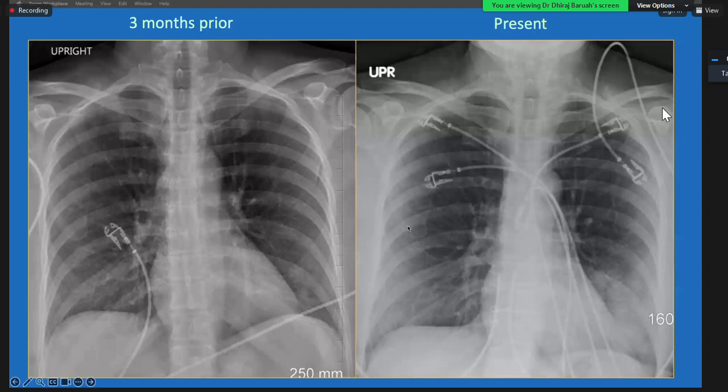a diagnosis. So in this patient, if this is developing acutely, the fluffy, irregular, round to oval opacities, they try to coalesce. So that is your airspace opacity. So there is something filling within the airways. So what can fill acutely? It will be fluid like edema, pus like pneumonia, hemorrhage in pulmonary hemorrhage, or food in aspiration. So you can make a differential based on how you see the opacity, and this is a case of pneumonia that we had presented with pneumonia.